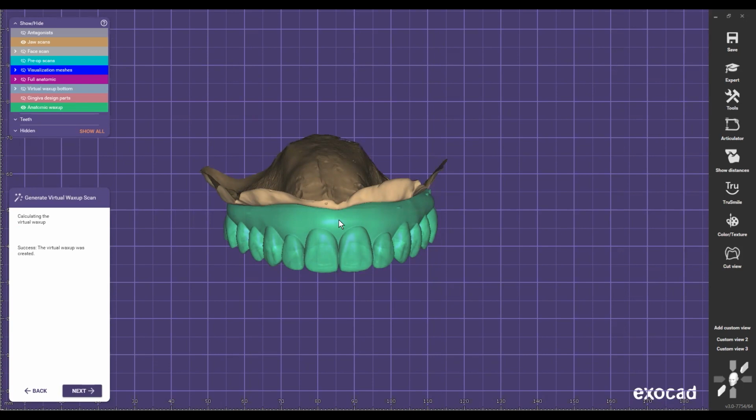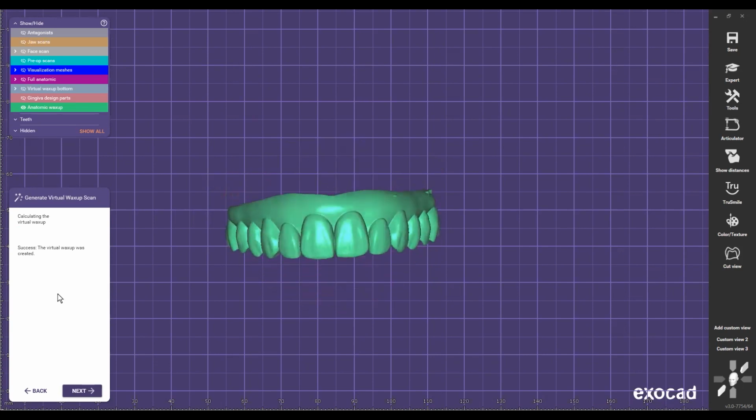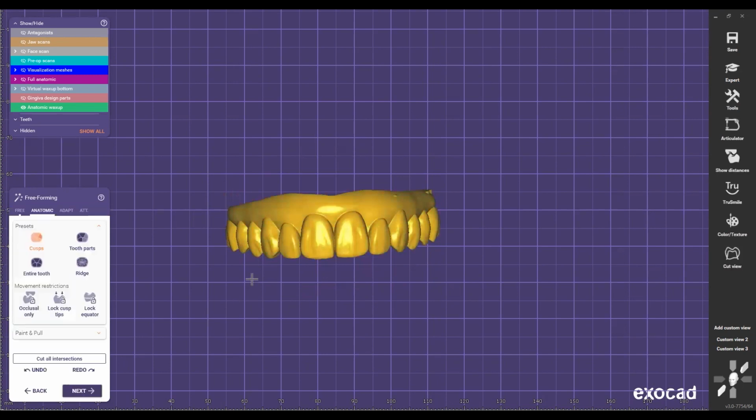And my goal is to be able to deliver that smile, so the patients feel like it was worth it for them to do this procedure. Okay. So now I have this, I go to the next step.